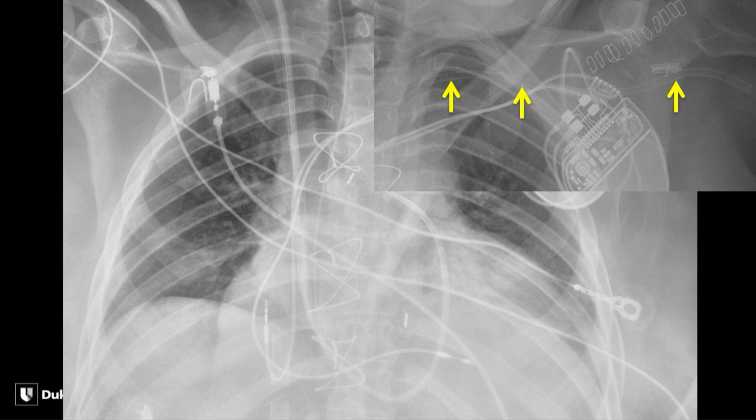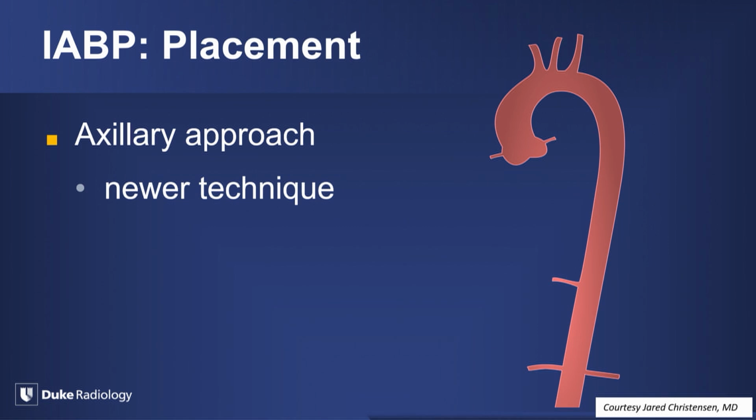How many people have seen these in your institution? Yeah. You know, our clinicians started using them, and I think it was about 3 years before we actually knew it, because we would see these grafts and wonder what they were. We finally figured out that they were putting these in to place the balloon from an axillary approach. So this is a newer technique. It's been around now 7 to 10 years or so.